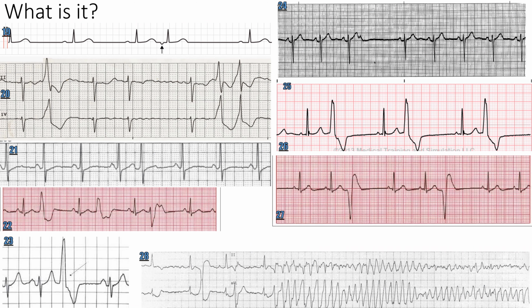All right, some more practice. So we got pointing to a P wave that is upside down. So it's coming from somewhere in the atria, probably close to the AV junction, and it's early. This looks like a slow rhythm, right? So this is a sinus brady, or we got a first degree AV block there too. Look at that. It's longer than a big box. This might be computer generated. I'm not sure if this is an accurate patient or not, but sinus brady with a first degree AV block, plus we got a little PAC thrown in there.